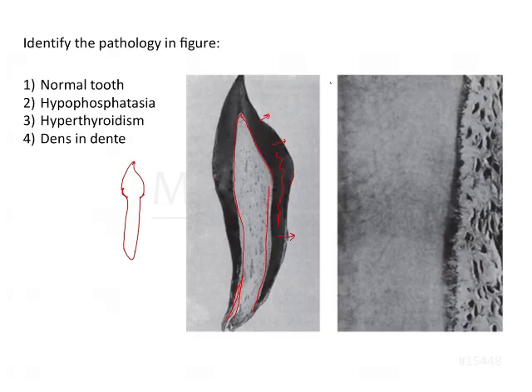In addition to that, when you see this image over here, what you're noticing is this granular formation. And if you can see faintly, these are the lines. So these are the dentinal tubules, the S-shaped curves. In addition to that, what you're seeing over here is the Tome's granular layer. Over here, this is the PDL because you're seeing plump spindle shaped cells with nuclei. So these are probably fibroblasts, and this is the PDL.